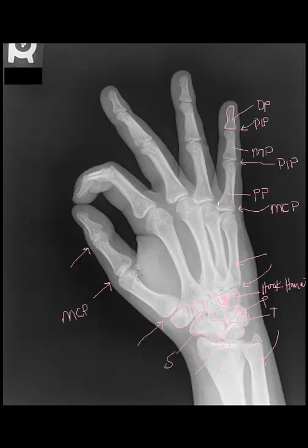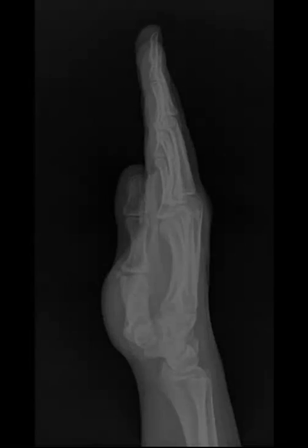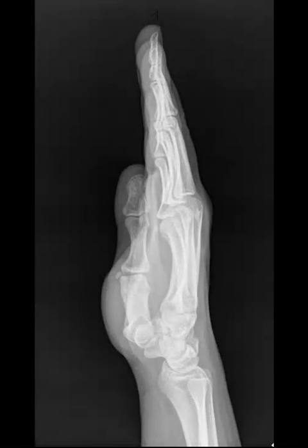Now we will move on to the lateral projection. We are now looking at the lateral projection. Let's start again with the bones of the wrist. Ulnar styloid, radius, radial styloid, lunate. Here is where we see the very nice lunar shape of the lunate. Now the lunate is going to stand out for you. It's going to be the first bone you see that's semilunar in shape, sitting directly on top of the radius. The rest gets a little more complicated.